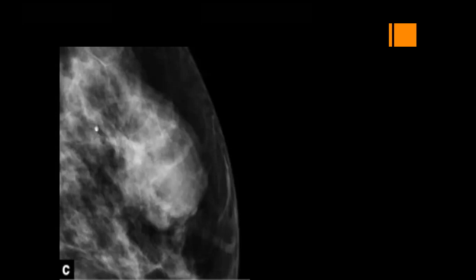Do BI-RADS 2. Do you agree, all of you? Do you agree BI-RADS 2 or not BI-RADS 2? Any fat containing lesion, put it in BI-RADS 2. All of the attendees, do you agree to code it as BI-RADS 2?